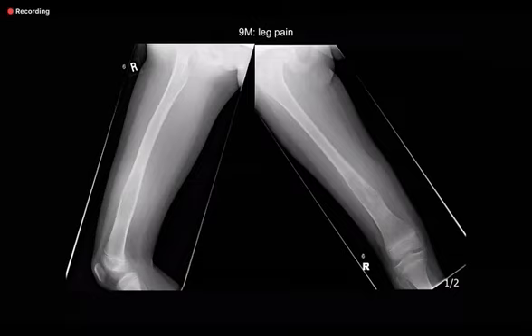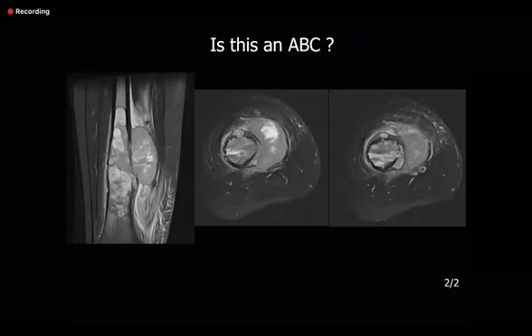However, there's an impression of a soft tissue component adjacent to this bone lesion, and it has a wide zone of transition. Overall, the features point towards an aggressive bony lesion. My current differential includes osteomyelitis or a primary bone tumor. What will you do? In my normal practice, I will organize an MRI for this patient.